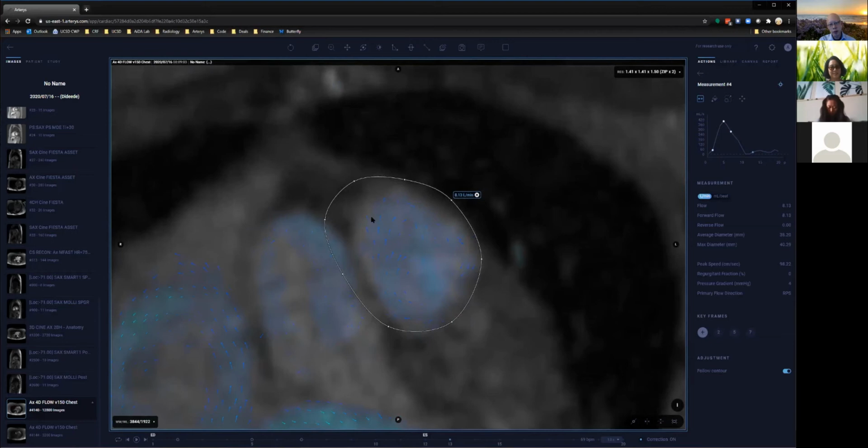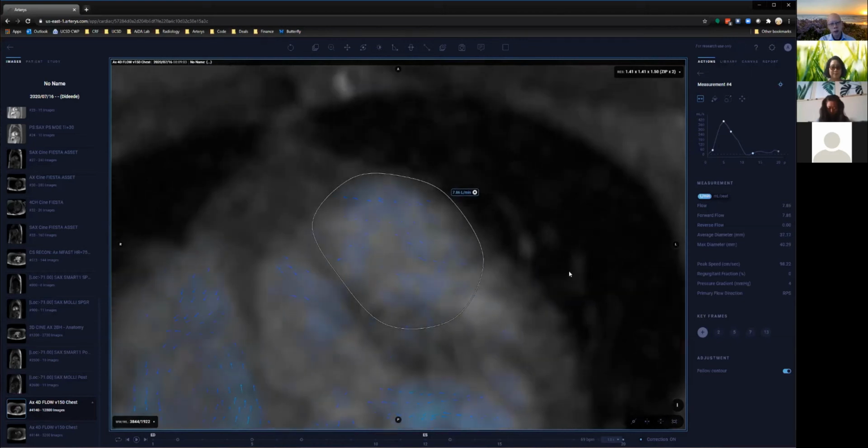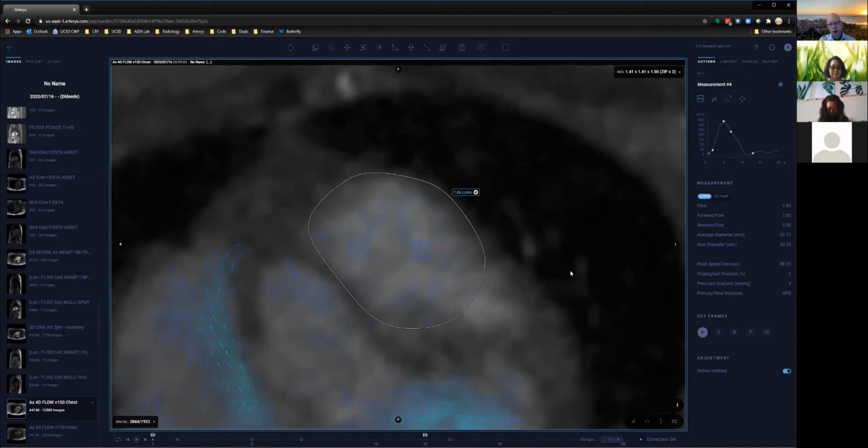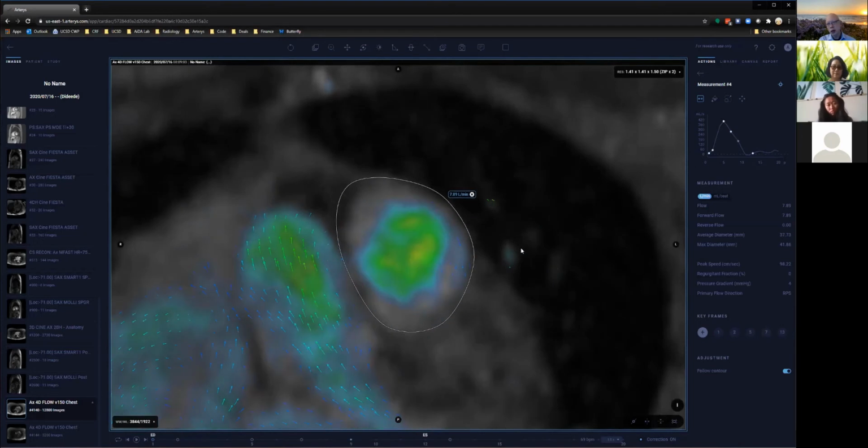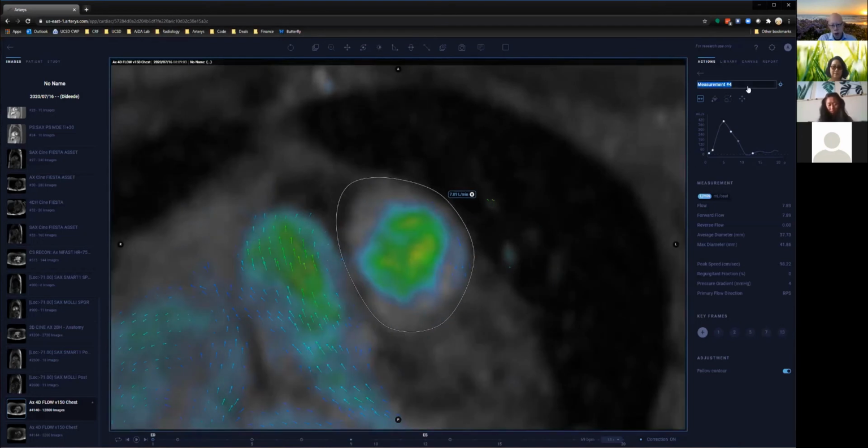This is basically how I do a pulmonary valve measurement, which Misha certainly, I'm sure, is familiar with. As you did this for that other case where you're looking for Epstein's or whatever. Or ASD, I don't know what that indication was. Okay, so that's our pulmonary valve measurement.